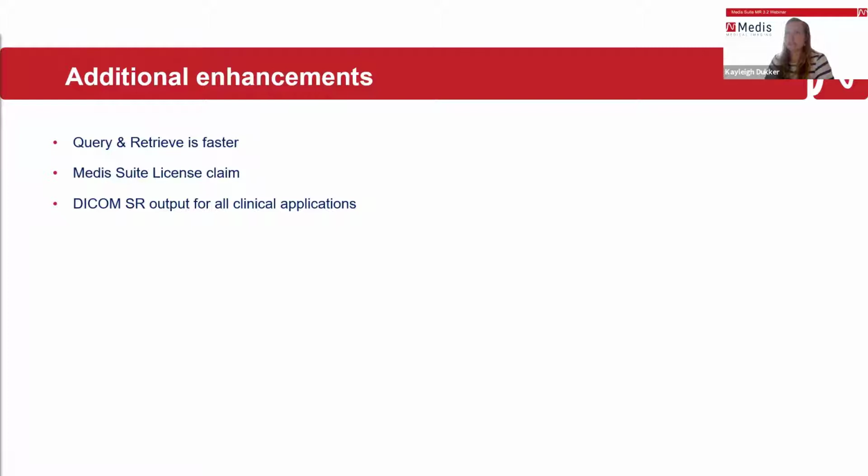And secondly, it will maybe be a bit more IT related, but the way that MediSuite claims a license is now a bit different. MediSuite will only claim a license once you open or load a patient. So when you just load the MediSuite environment, no license is claimed.